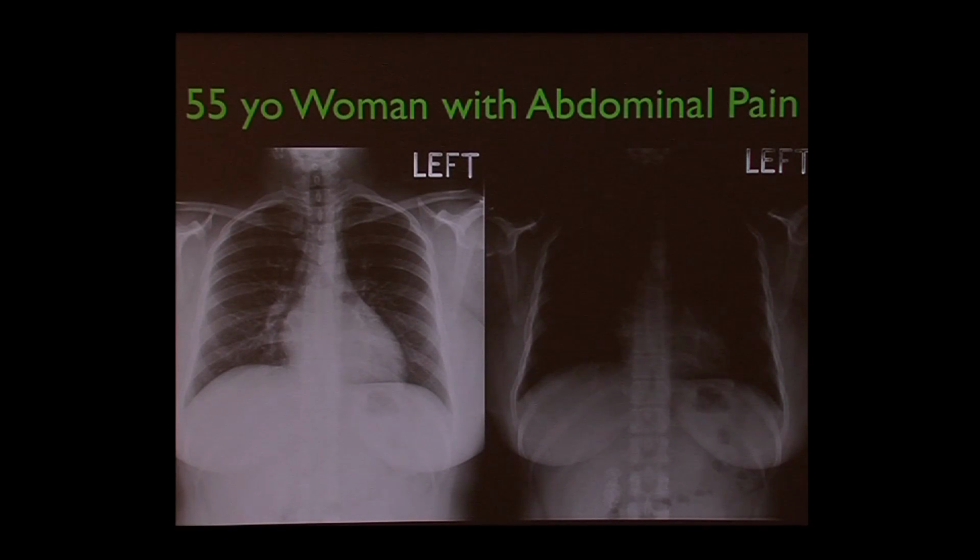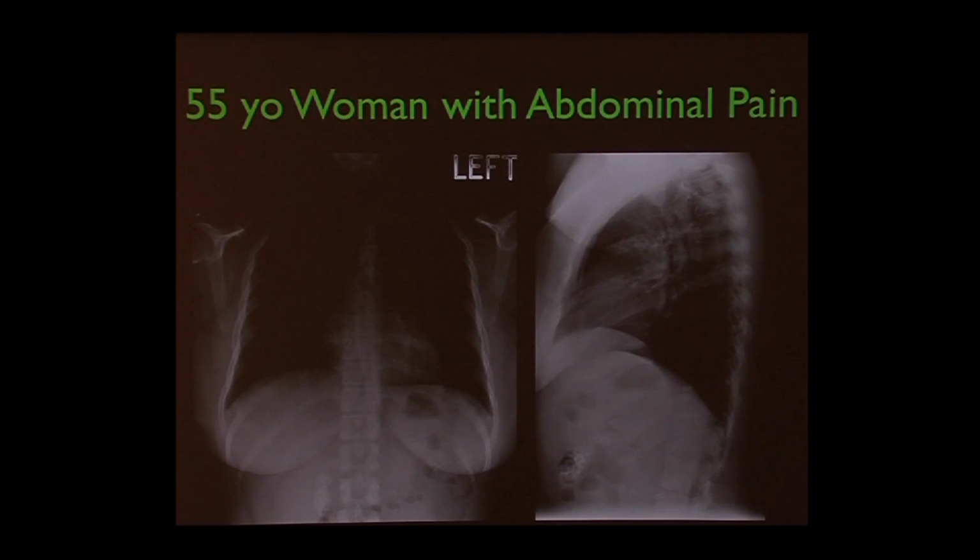You know what that is? Here is the frontal view, and here's the lateral view. Those are gallstones sitting in the gallbladder. But if we don't bring out the detail under the diaphragm, we would never know it was there on the original X-ray. And in the old days, before we could manipulate it, that's all we had. In that white area beneath the diaphragm, nothing we could have done. There's no way we would have seen those on the original, in the old days before computerized, digital imaging.